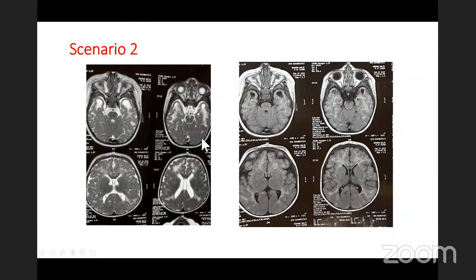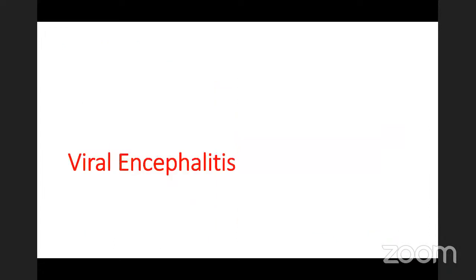This type of leukoencephalopathy, that is bilateral symmetrical white matter changes with anterior temporal cysts, is very much suggestive of congenital CMV infection. If we find such an MRI in a child having microcephaly, chorioretinitis, or presenting with hepatosplenomegaly and hearing loss, always think of congenital CMV. And if it is within the purview, then we can also have the child treated.